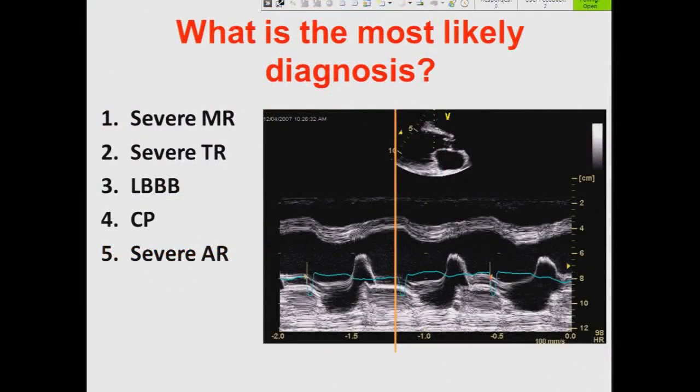Yeah, good point. Okay. This, I think, should be strangely familiar to you also from the pretest examination. And Dr. Kronzen covered this in detail, so I'm not going to go for the audience response on this one. But the most likely diagnosis here is severe aortic regurgitation. And just to help you out a bit, I did put in a vertical line right at the QRS so that you see how prematurely the mitral valve closes. It closes, could I get an arrow somehow?